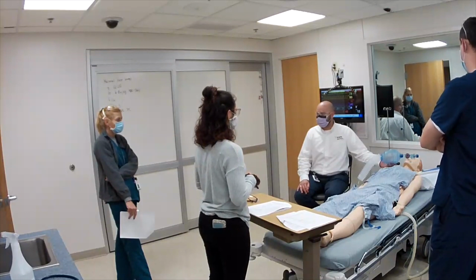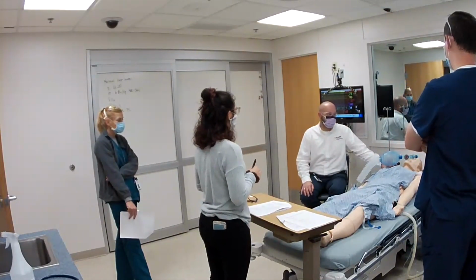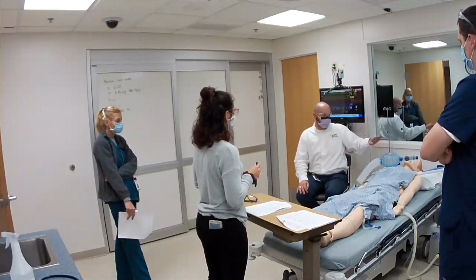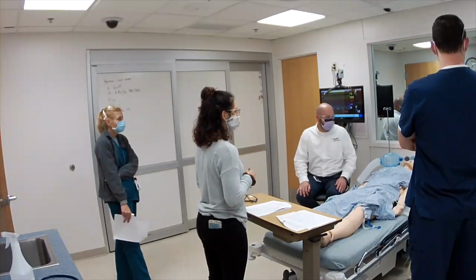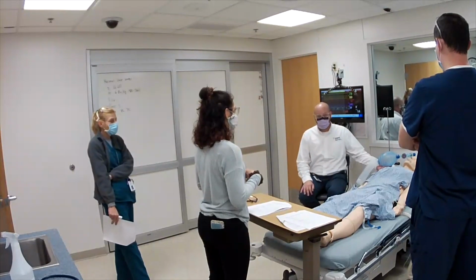So, what do you think we should put Stanley on? I'm doing all the work here for Stanley. He's totally unresponsive. He's not doing anything on this. I would go with volume control. Okay, let's put him on volume control, and we have to pick some numbers here, right? So what tidal volume do you want?